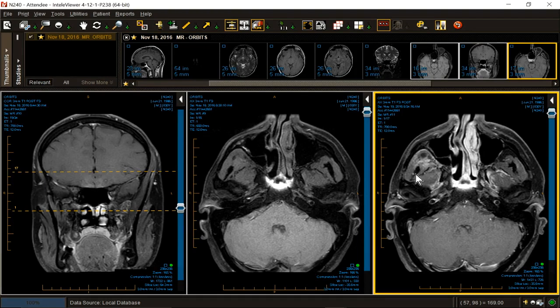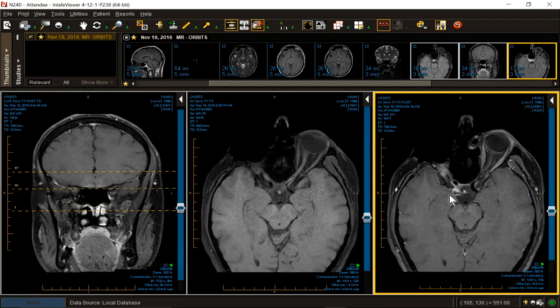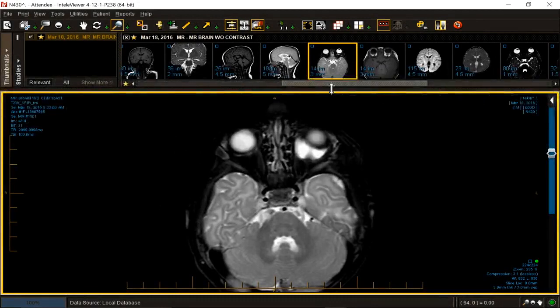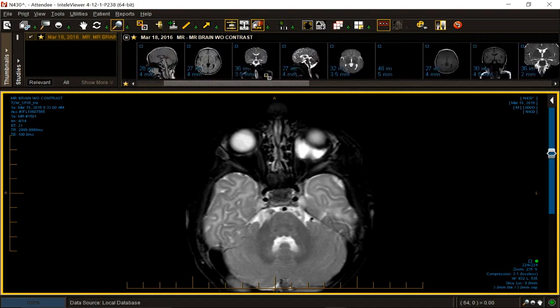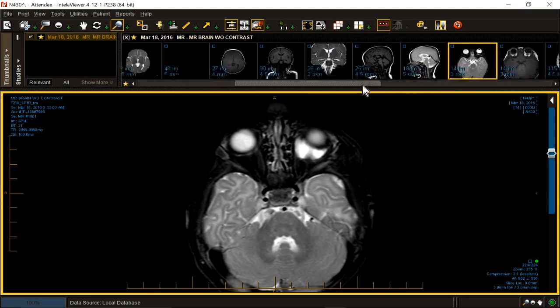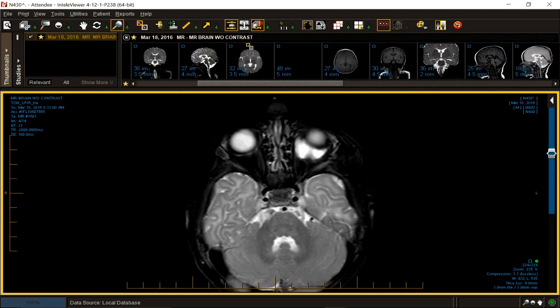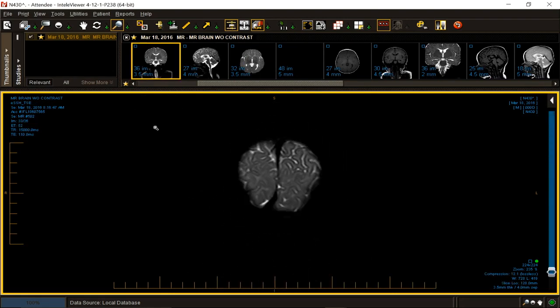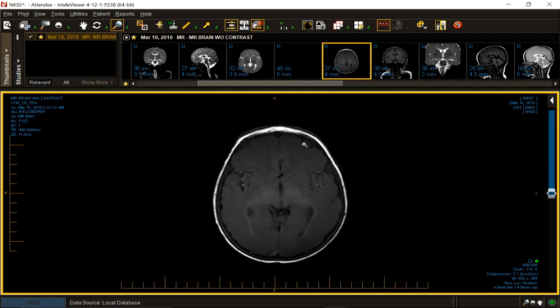The take-home message here is anterior to posterior extension, getting to the slightly bulky, thickened cavernous sinus on the right through the foramen rotundum, and if you had a CT, you'd see Vidian canal. I would urge you to scroll to the far right while I take a more mundane route through the basal brain, making sure there aren't any basilar artery dissecting aneurysms.